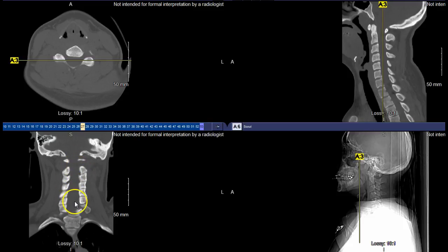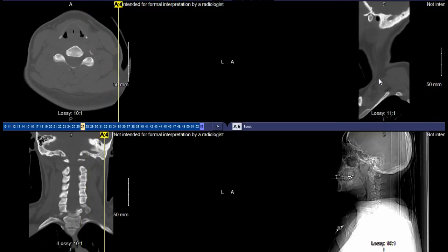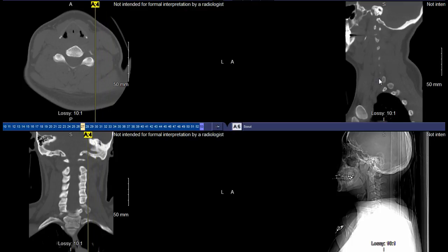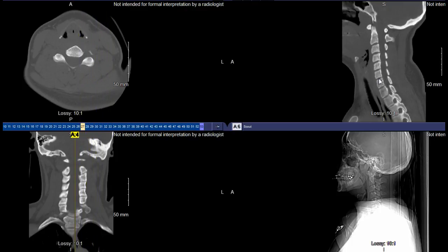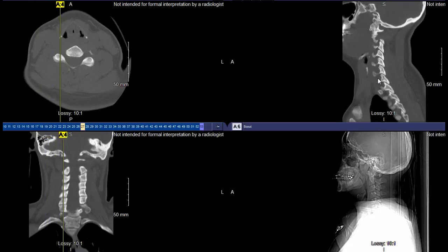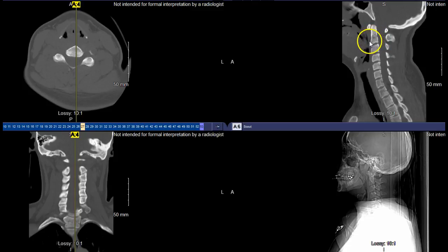You can see the region of the spinal cord there as well. And just to quickly go through things on the sagittal images, so you can see where we're at, going from patient left over here through the midline and then transitioning into patient right and subsequently going back to about midline, because we can start to see some of those structures that we know. You can see those bodies very, very well. And like I emphasized during the lecture, you can see where the odontoid process is, because you can see that fusion of bone here that's taking place.